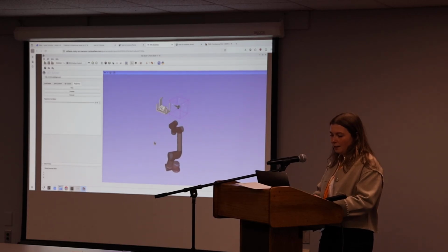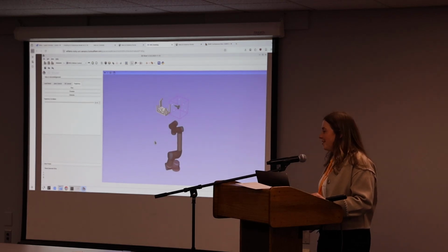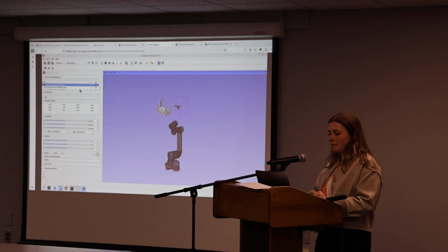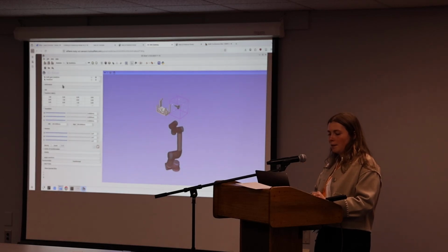The spine is higher than it should be because our robot is lower than it should be, so we're going to improvise and move it around and try to be useful for you. To do that, and this is useful in general, you go to the Transform tab. I'll stop quickly. Is everyone caught up on where we are right now? Yeah? Okay, so if you go to the Transform tab and you select, let me just check if we already have one in this scene.